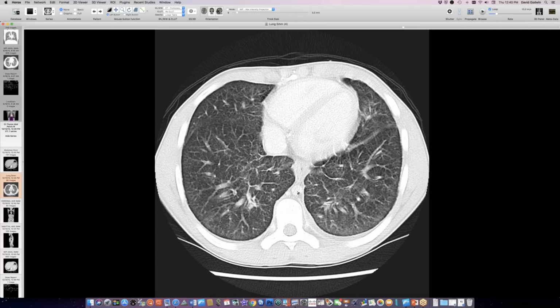He was put on anti-inflammatory medications and got much better. His follow-up CT, which is the one that I inadvertently showed first, was a year later, and everything has gone back to normal. His lungs are clear, and the lymphadenopathy is gone.